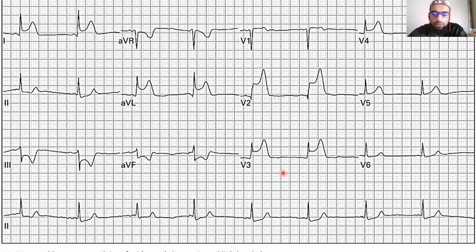All right. So from our rhythm already, we know we've got a possible AV junctional rhythm, or like I say, a re-entry circuit. But the re-entry circuits will give you tachys. This doesn't mean AV junctions don't give you tachys. But because this particular one doesn't have a tachy, we assume it's just a normal AV junctional rhythm. And we say that we've got to worry about ischemia, given the history and already what we're seeing over here. But besides that, our rhythm is okay.